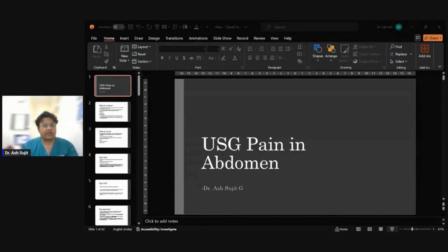Whenever you have an adnexal benign mass, you think about these things which can happen. It's commonly noted in pregnancy, in the younger age group, and in dermoid, because at that time the ovary is voluminous and the blood supply increases, so the ovary has more chance of undergoing torsion. They present with acute abdominal pain with non-specific vomiting and nausea. The sonographic appearance of ovarian torsion can vary with the degree of pedicle twisting, the degree of vascular compromise, the time delay between the sonography and the onset of symptoms, and the presence or absence of any concomitant ovarian mass or cyst.